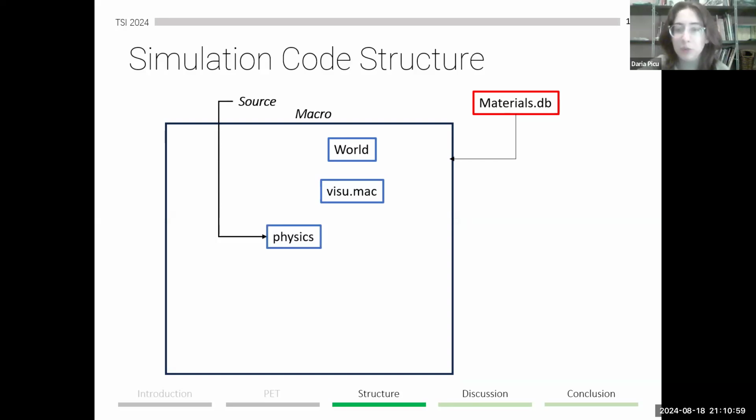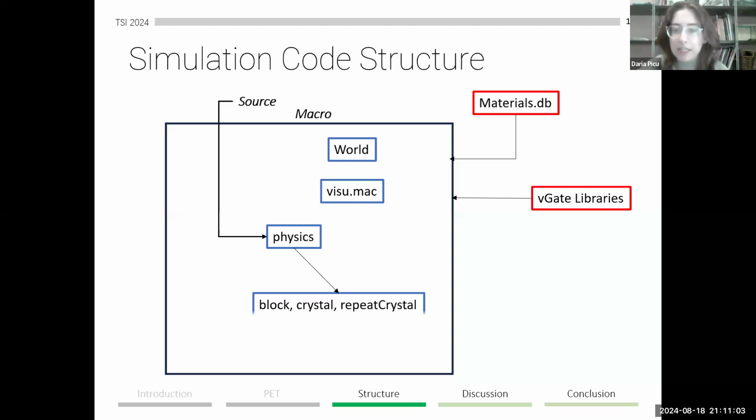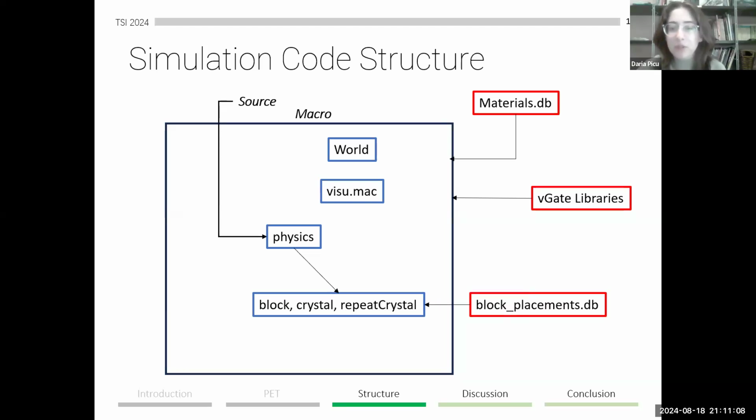We create individual blocks, which are daughters of the mother PET scanner, and each block contains crystals of known dimensions. Each block is replicated and placed at different locations to form a cylinder shape suitable for imaging a human head. In this case, we decided that the X dimension of the crystal is going to represent the thickness, which is a key parameter that we're going to vary in the simulation.